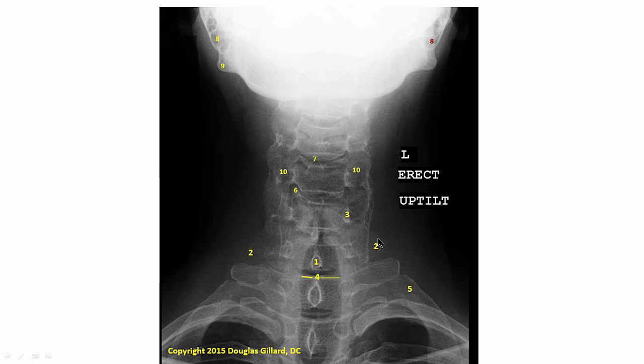Hey, we got a radiograph here. So let's go through this. Let's start right out here. You can see the soap bubbles give this away. There's your mastoid process. There's another one over here. Now what are these big bumps? Put your hand under the inferior ramus of your jawbone and go back toward the angle. You'll feel a dip and a bump. So guess what that is? That's the angle of the mandible. You can really feel that.